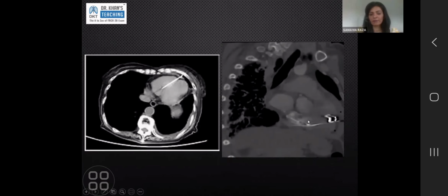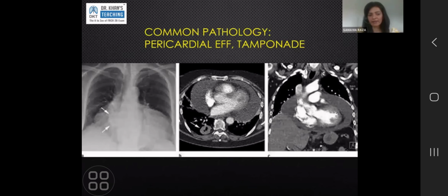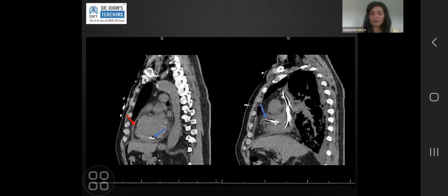When it's clear like that, so far gone, and there is clear pericardial effusion, it becomes more straightforward. When it is subtle like that, it's more tricky. So if you were to call that as suspicious of pericardial perforation, but the cardiologist is happy that it's pacing, and I don't think so, you shouldn't go around pulling a pacemaker out based on imaging. It is a clinical decision and should be led clinically.